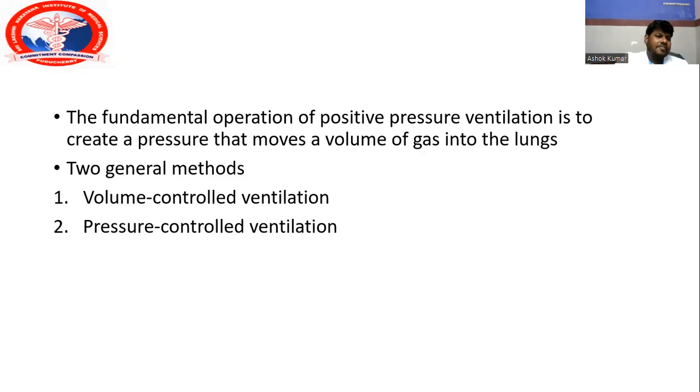Then all the respective images show the most commonly used ventilator in our institute. To know the details, we want to know the complete setup of the ventilator used in our institute. That starts with the power supply, the white one and the black one. The white one is connected to the hospital pipeline supply, and the black one is connected to the compressed air release. Then switch on the ventilator.